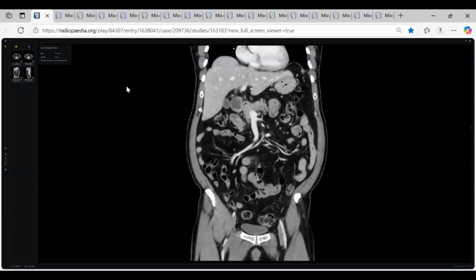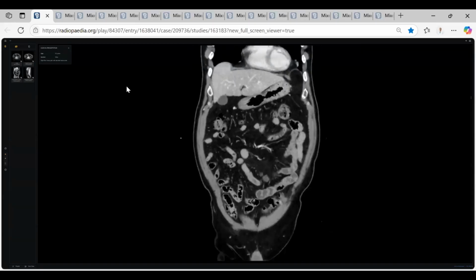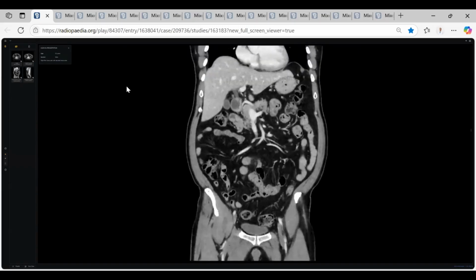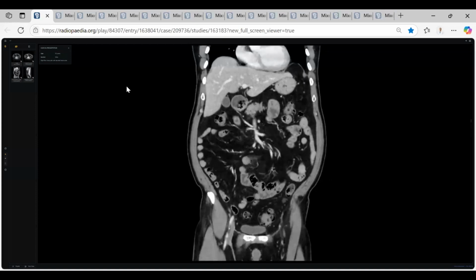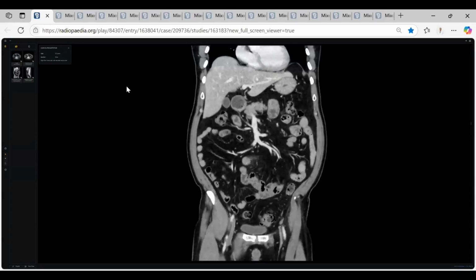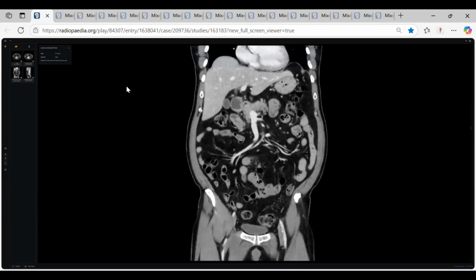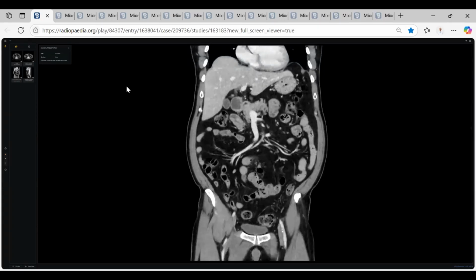Give me a differential diagnosis, doctor. I will take the history of the patient. If there is a history of recent surgery, it can represent gossypyboma. If it is calcific density, it can represent a foreign body. I will check if there is any perforation in the bowel.